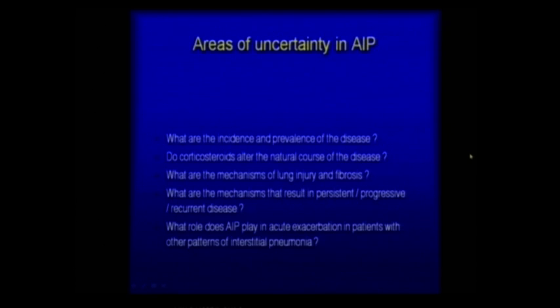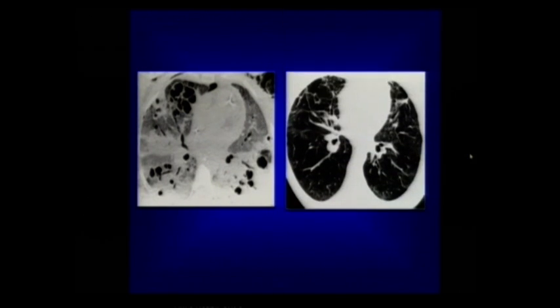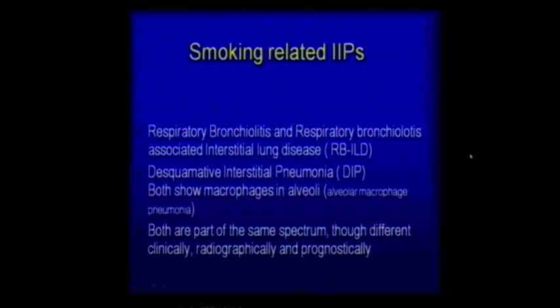So, amongst all the diseases of idiopathic interstitial pneumonias, probably this is the most important one, because this sets in suddenly and it has got 50% of mortality. See, even if they recover, you get a lung something like this. Actually, it is not normal. Several parts have actually lost lung tissue, destroyed lung tissue is there, and some fibrosis. The lung function will be very poor in that patient.